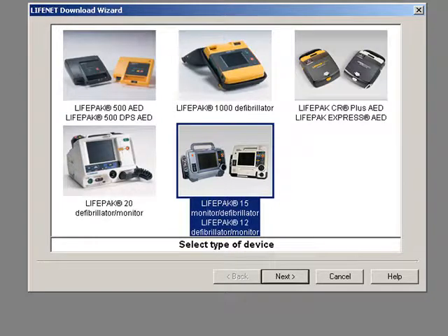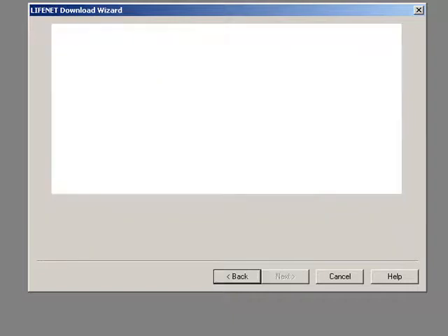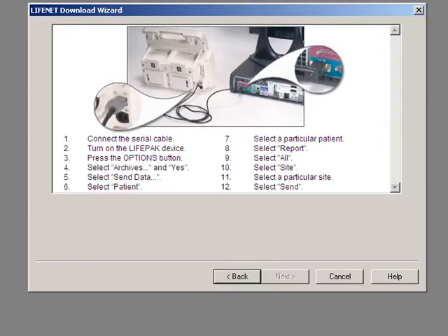This particular computer is running particularly slowly because the Camtasia program is working. In most cases this will take just a second or two. Once you've told it which monitor you're using, and in most cases as soon as the program opens up, your instructions for uploading an EKG will appear on the screen. There's no longer a need to have a laminated sheet next to each computer to remind us of the process.